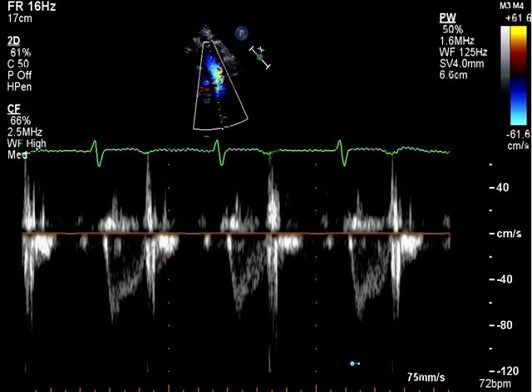Similarly, when you look at the pulse Doppler flow through the pulmonic valve, you can see a little notch in each waveform. So the flow starts, and then it sort of comes down quickly and then restarts in the middle of systole. And you can see that in each of the 3 beats that I've provided here.